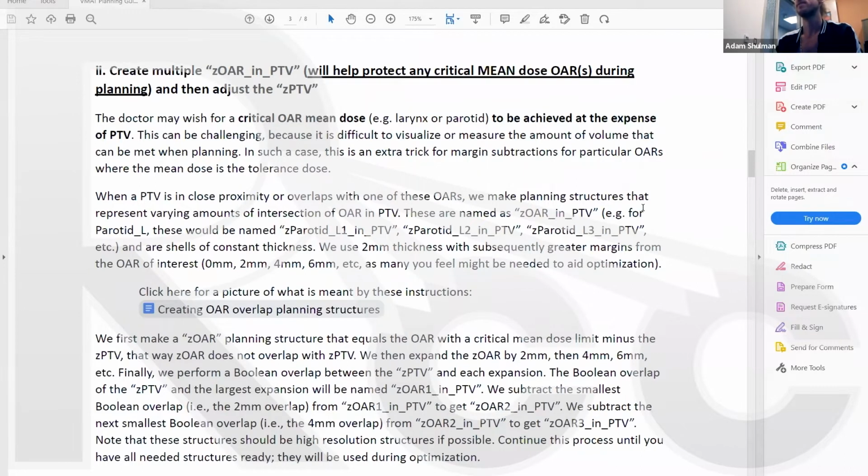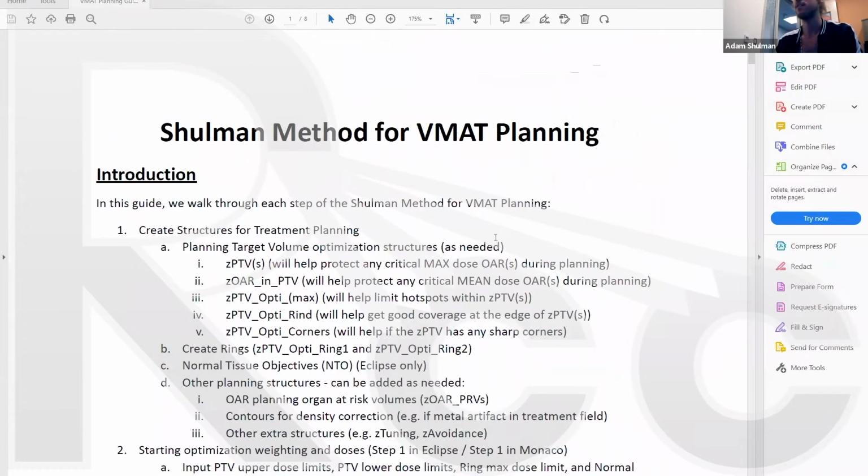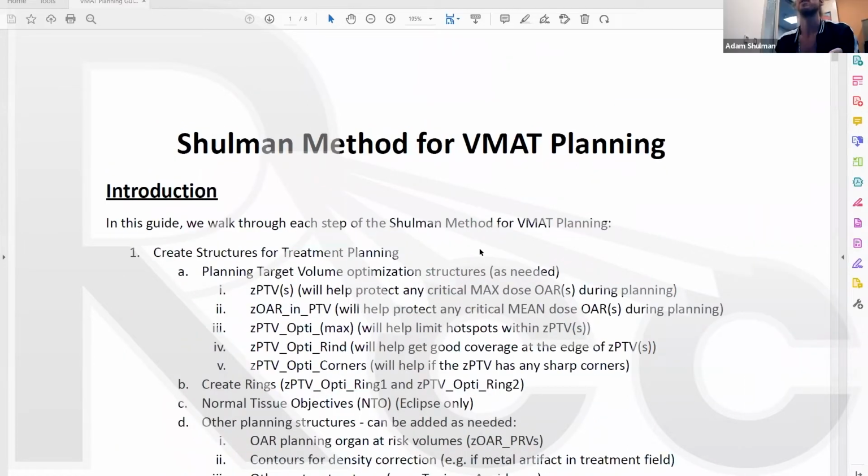First we've got this really nice treatment planning document. Again, Ben and Claire helped a lot, and Ben really made it nice with some embedded instructions. We'll go over this at the same time that we go over our live demonstrations in the treatment planning system. I'll be swapping back and forth between this document and my Eclipse system.